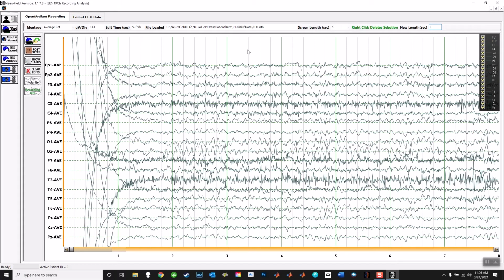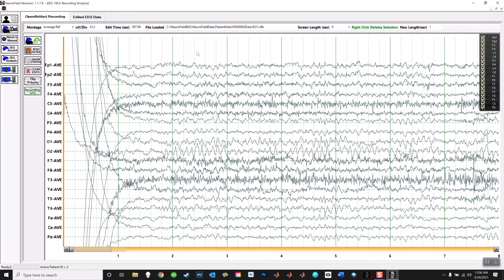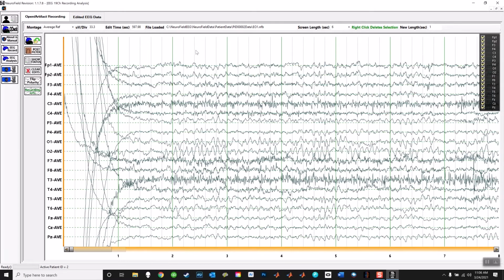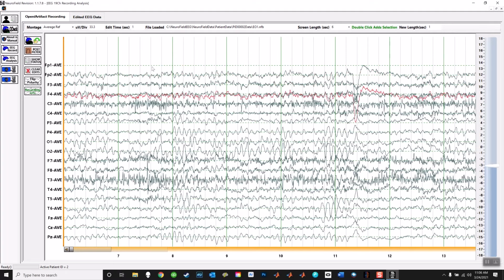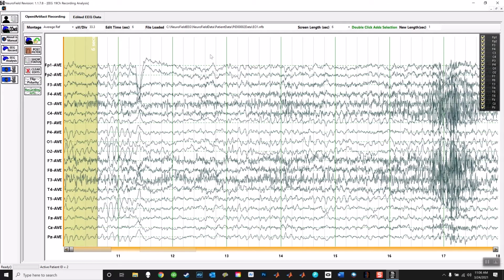Now in traditional EEG artifacting, you want to go through the process of selecting data. If I click in the field, my right and left arrow keys on my keyboard will become active. So I want to start grabbing some EEG data. Now you make your selections, you grab your data, and whoops, I just turned on my little screen here. And grab your data and then pull it to grab a chunk of data.